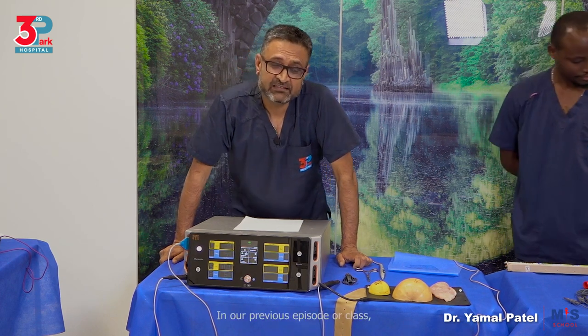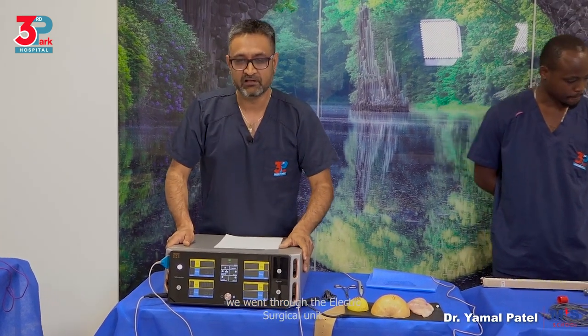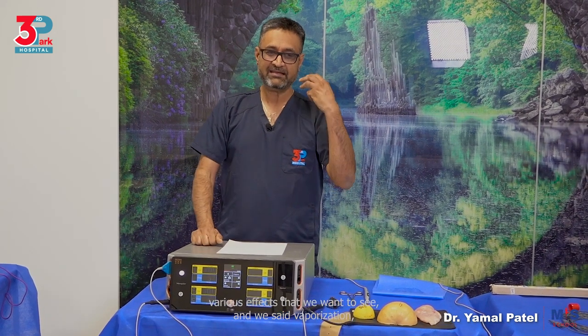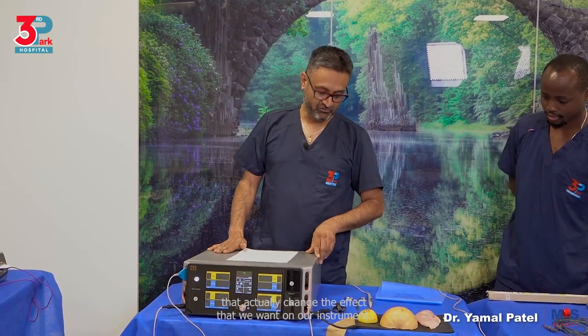In our previous episode or class, we went through the electrosurgical unit. We discussed the different waveforms and modes. We discussed the various effects that we want to see, and we said vaporization, desiccation, and fulguration as our effects of interest. We discussed the return electrode and the monopolar circuit. We discussed the various variables that actually change the effect that we want on our instrument.